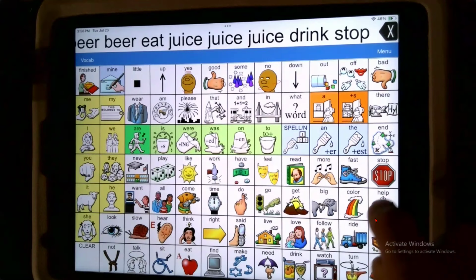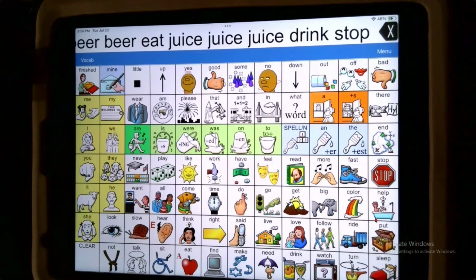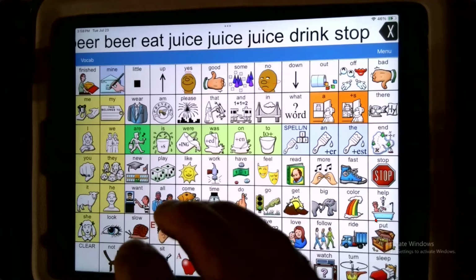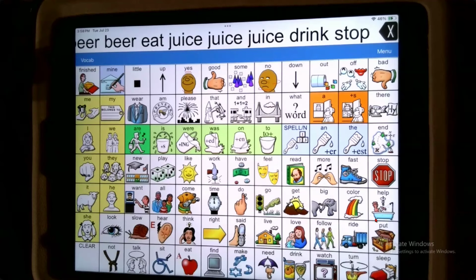Stop. If it says visit, the name of that button, if it says visit stop, visit go, visit eat, it would then be on the full level. With vocabulary builder on, it reduces what you're seeing. Okay, I know that's confusing, but trust me, that lets you set a device to the exact level for each kid and lets you add words throughout the years and never have to be on a new system because you can start at cause and effect and have the projection that they're going to go to college or whatever level they want to go to.